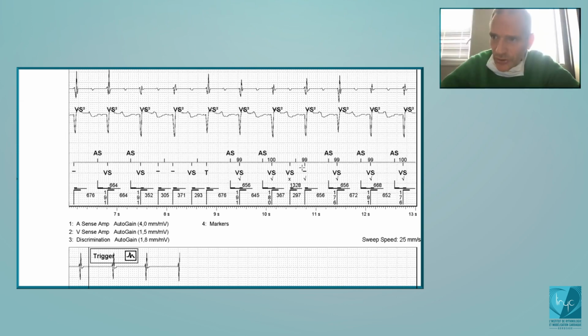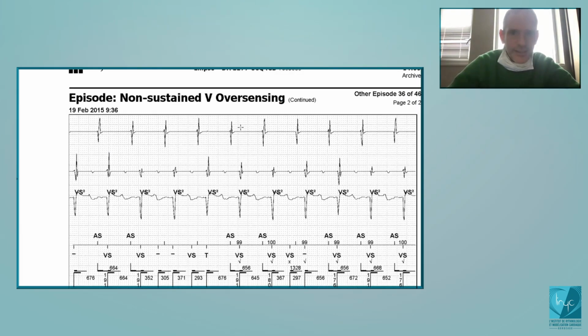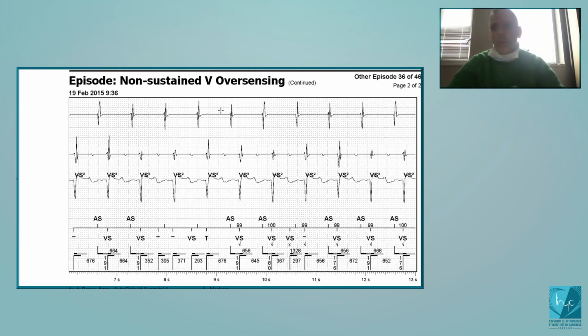Anytime your noise counter will reach the value of 10, then there's going to be recalling of what is called a non-sustained oversensing. That's clear? Yes. So now, and that's the same in case of lead dysfunction.